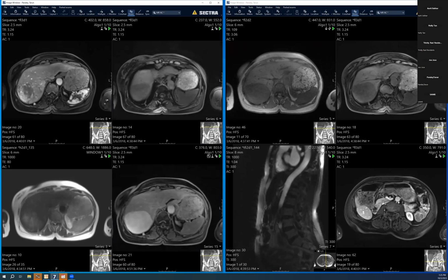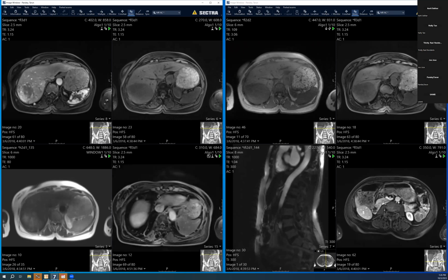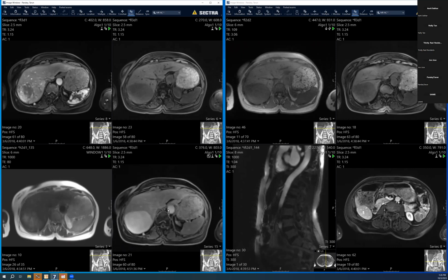So EMD, that's what we thought. But since you guys showed a solitary fibrous tumor, Kedar found this case especially for you. This is a solitary fibrous tumor. It was biopsied, and it's separate from the ligament. And I always get tricked by these. But you know what? This actually shows you how the T2 can look so variable.